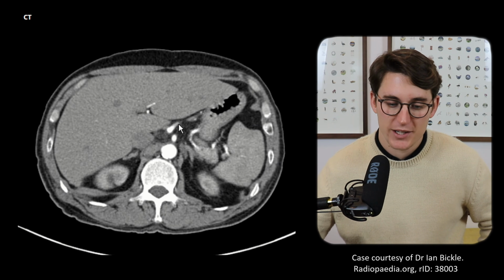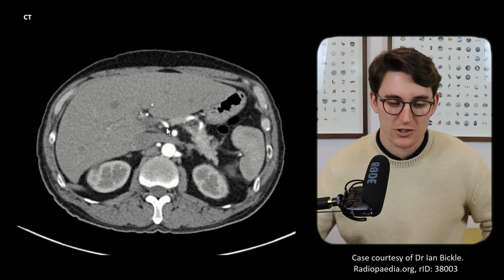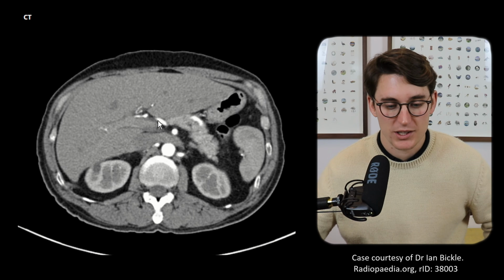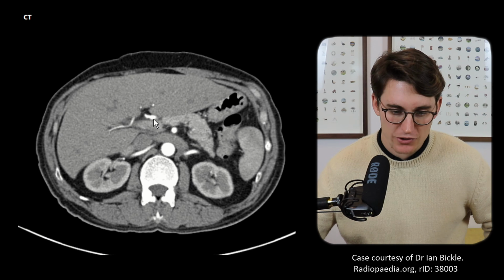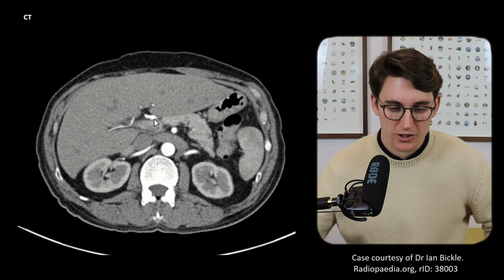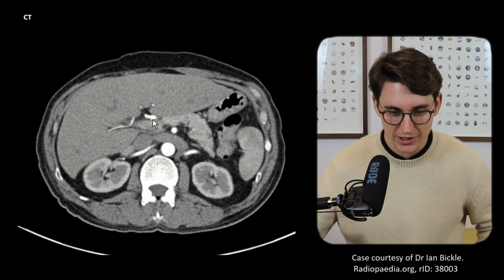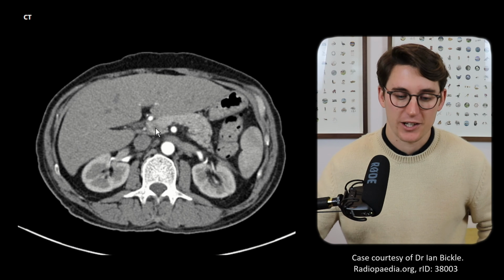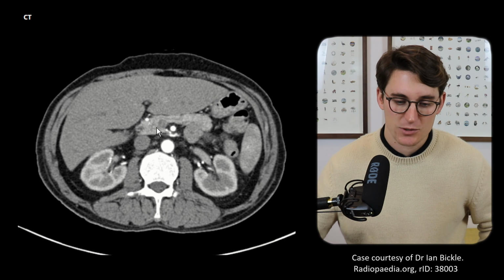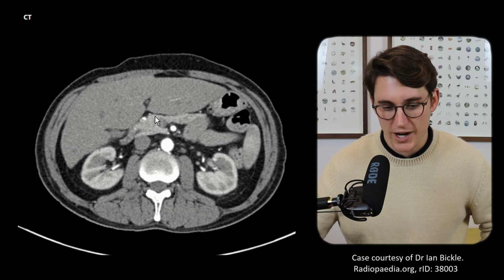Let's go back up to where the splenic artery came off. We know that the other branch here is called our common hepatic artery. We can see that heading off towards the liver itself. So this is our common hepatic artery, and in this case, the hepatic artery breaks off to our gastroduodenal artery first. We can see it dive down there. You see how it dives down like that. We can see our pancreas here and our inferior vena cava here, and as we come down, we follow it, it then gives off this small branch, which is our right gastric artery.